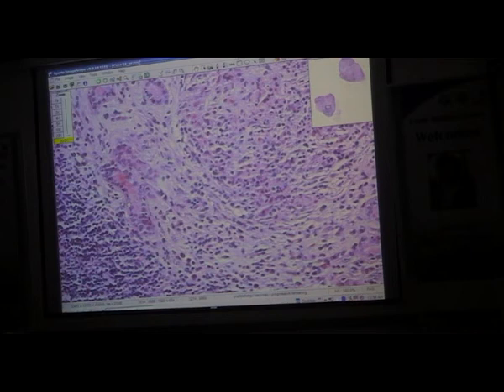After all, the lacrimal gland is nothing more or less than a minor salivary gland. So the pathology of the lacrimal gland is really salivary gland pathology. Please bear with me for a moment. We do not have here, and you can see inflammation. There's definitely inflammation. You can see the lymphocytes. I'm not hiding it from you. So what are the possibilities that I have inflammation inside the lacrimal gland?